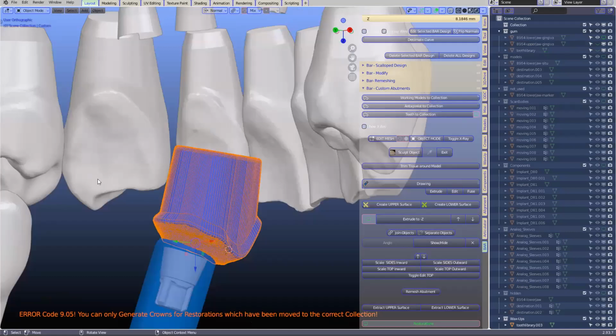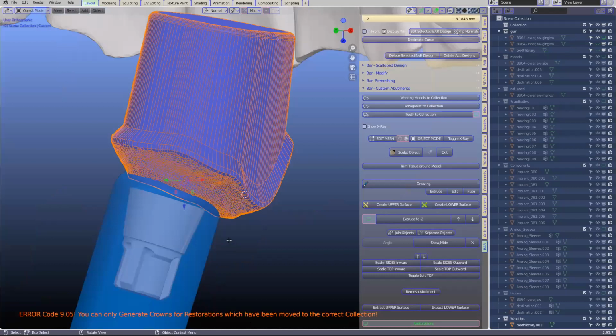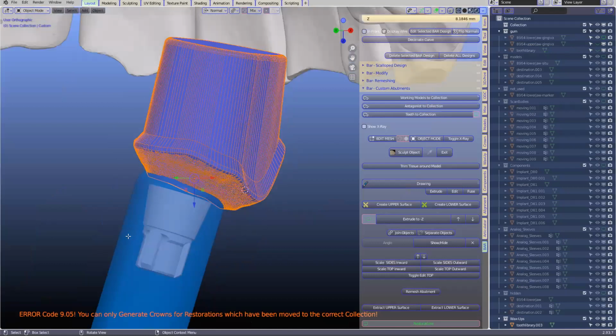They are just straight. That means you've got to pull it up in those areas of the downward slope, correct? Exactly. So I'm just going to move that up a little bit, because this whole thing has to attach to that.